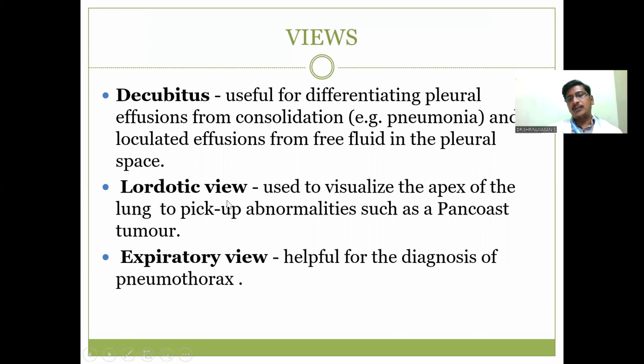What do you mean by lordotic view? Lordotic view is mainly used to visualize the apex of the lung, to pick up any abnormalities which will affect the apex of the lung. For example, any apical malignancy like Pancoast tumor or apical collapse, that we can pick up by lordotic view.